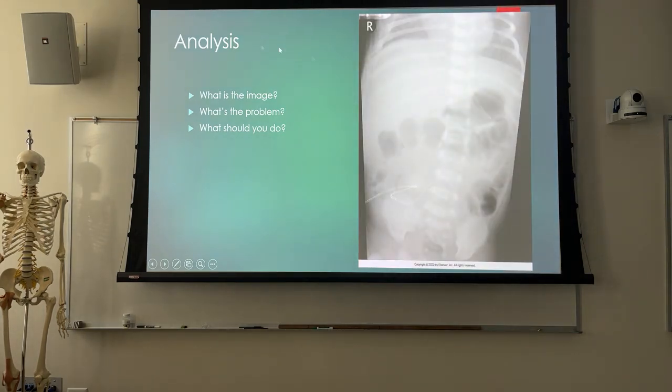So I think what we've got here is a UVC catheter, possibly. I don't know that for sure. This is also a little bit of a train wreck. We don't have bladder. We've got too much lung. But if that's what we're looking for, most of the time it's going to go from here up into the vena cava.